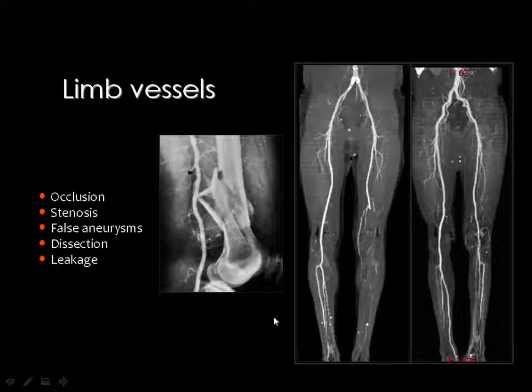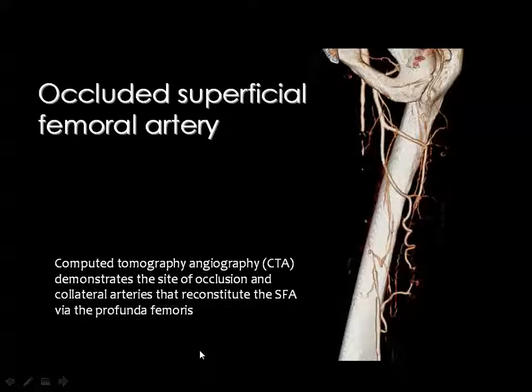And very importantly, in the casualty and emergency room, instead of doing direct femoral angiography as has been performed previously, we may inject the contrast intravenously and show the circulation of both lower limbs in a few seconds. And this is an example of a 3D reconstructed image of the thigh, showing this is the common femoral artery, and this is the deep femoral, which is intact, and the superficial femoral is occluded from here up to this level.